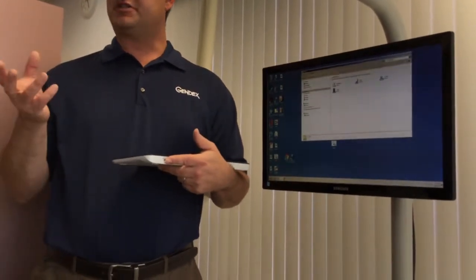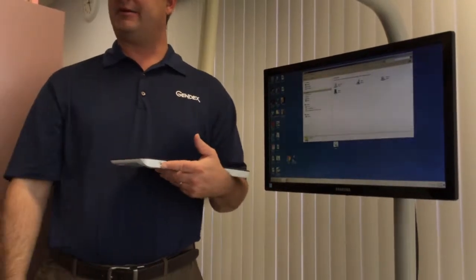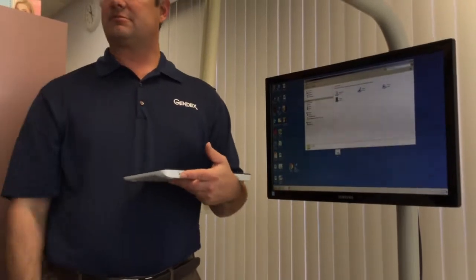Even if you want to practice just taking shots, put something like a phone or a stapler in the pan. You can't hurt it. If you want to just practice taking pans, we can put it on a training mode all the time. It just won't actually shoot anything, and it's just to be familiar with the machine.